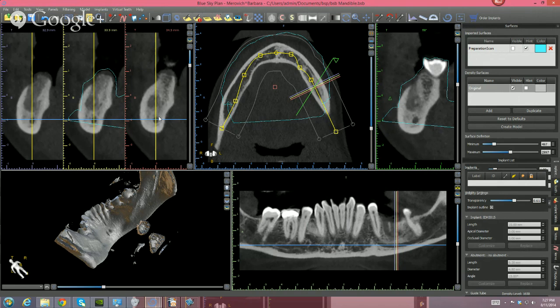But you know what? It's very nice to be a cowboy, but my patients aren't horses, and I'd rather not ride on the horse and be a little bit safer, right? In the end, safety first. So that's one of the reasons why the cone beam is important, and why the identification of this undercut right here is so important.